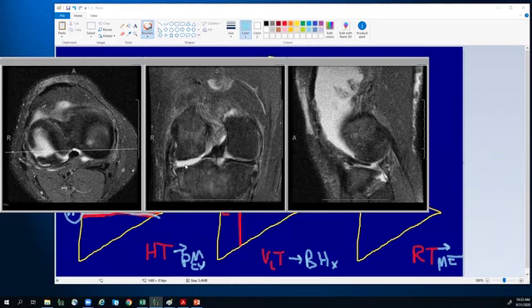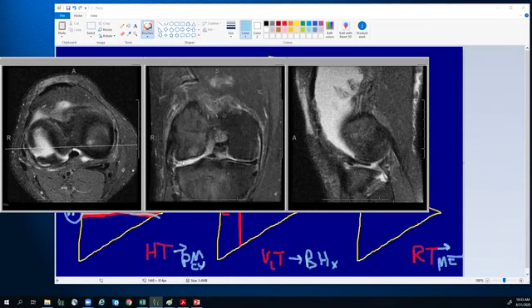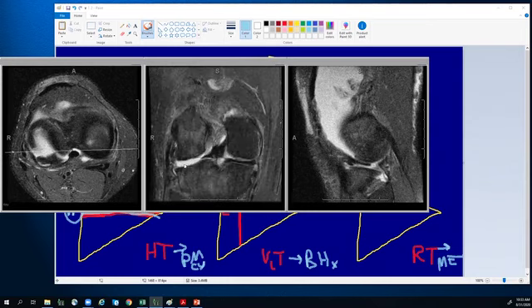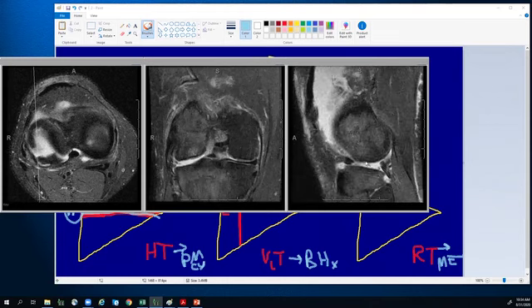They've basically lost the shock absorber. You can see there's no more shock absorber at this location, and you could see that the articular cartilage of the lateral compartment is almost completely lost. And this is very common in people that have these radial tears. Also, people with meniscal extrusion, it's very common to lose cartilage.